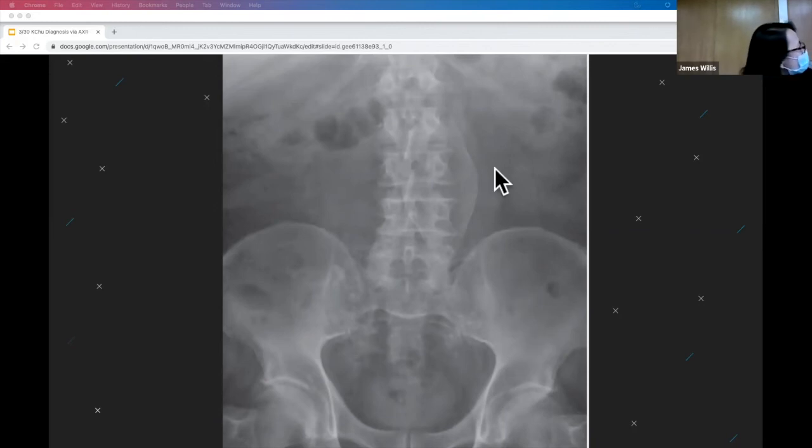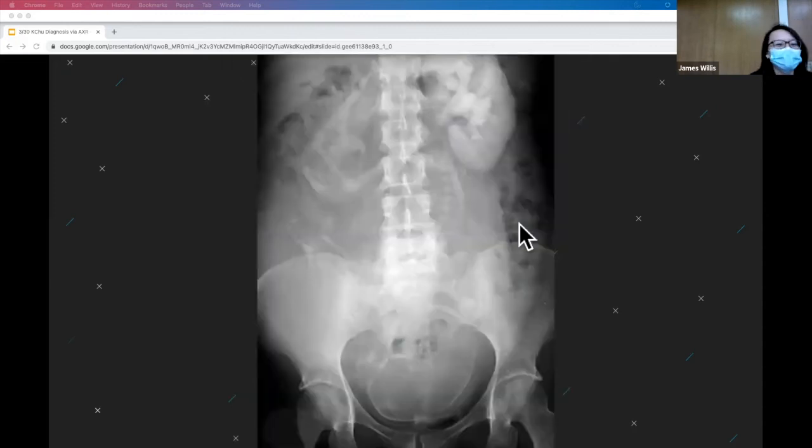It's kind of hard to see, but there's an outlining here where a large vessel goes right in the center of the body. Yeah, this is a calcified AAA. It's a fusiform AAA. Okay, Pierre.